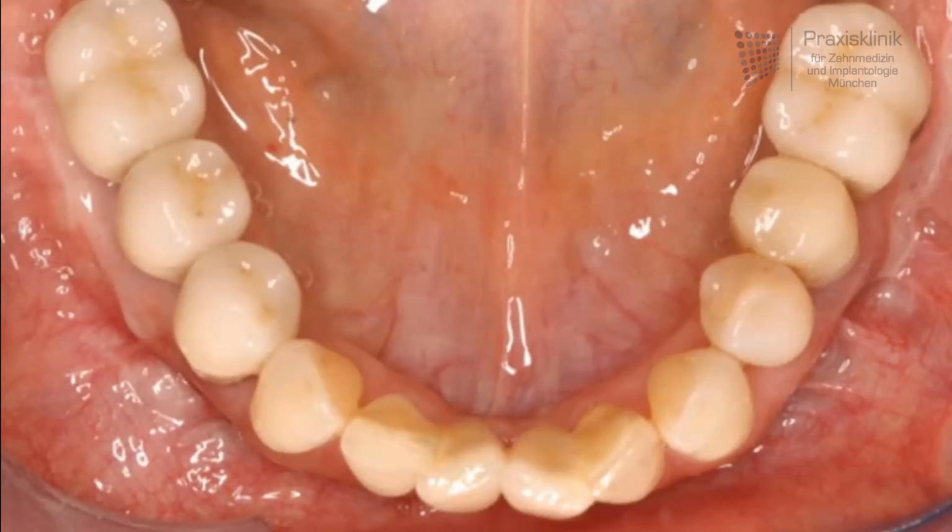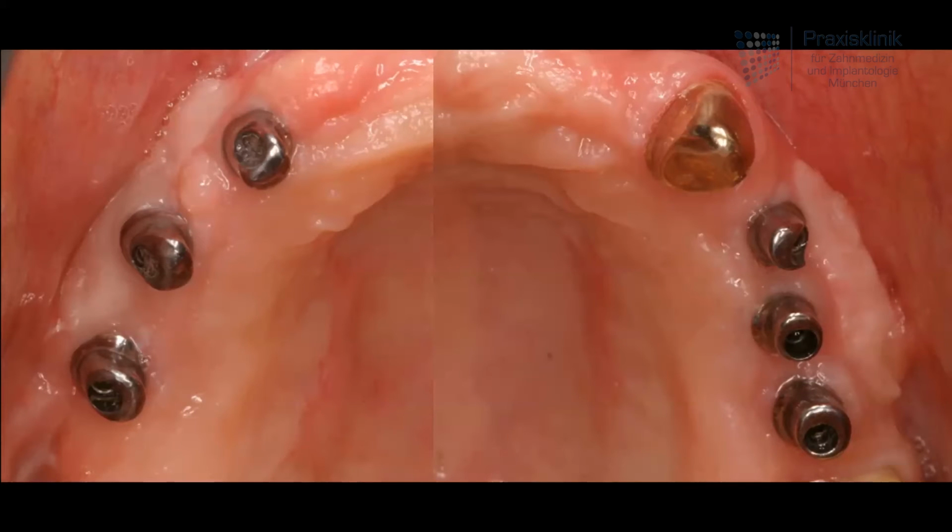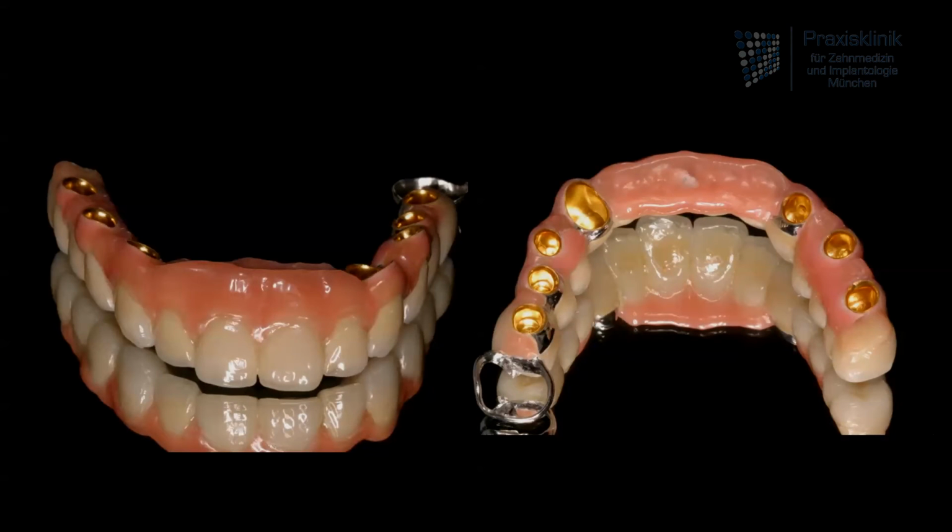With regard to the upper jaw, we decided to provide a combined fixed and removable prosthesis to the patient because we had a severe history of periodontitis. We have a massive loss of bone and soft tissue in a vertical dimension. That's why we have to replace the gum as well as the teeth. So if we want to have a very aesthetic outcome, then it is only possible to provide artificial gum in combination with a removable prosthesis.